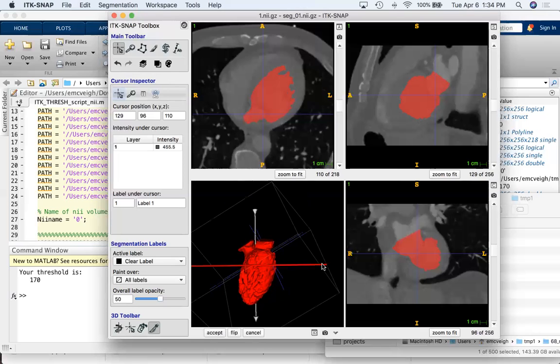Like that. Okay. I've tried to understand how that works, like a left-hand, right-hand rule or something. I can't. I just try one and then if it's wrong, I just redo it. I don't know why I can't figure out what the algorithm is, but anyway, I quit trying.